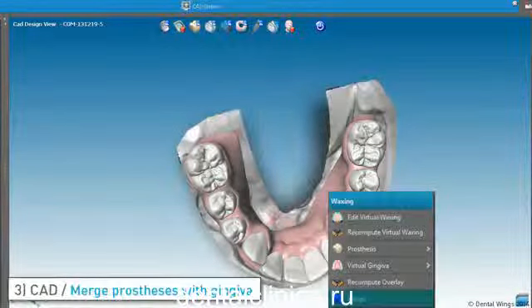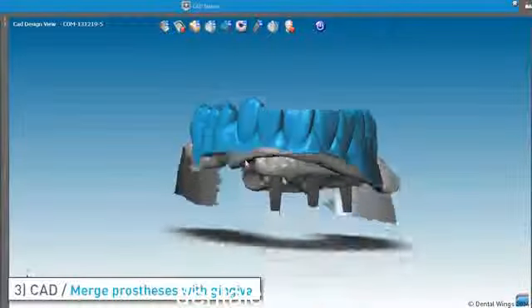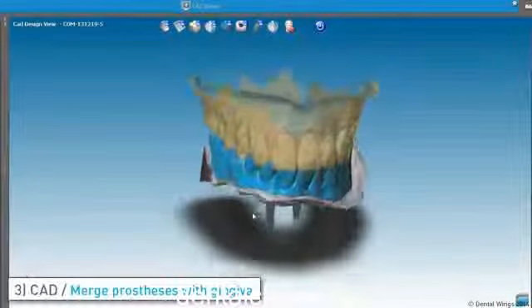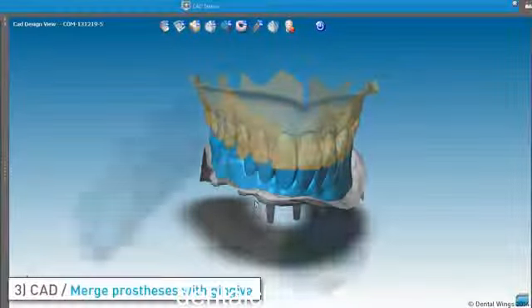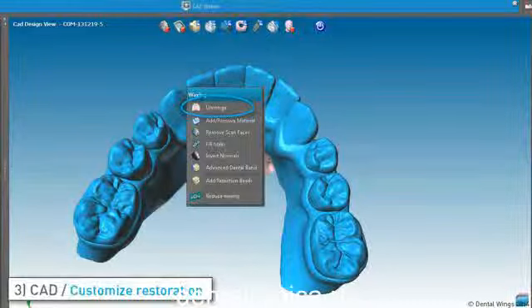Once the anatomies and gingiva are merged, the result is managed just as a waxing that would have been scanned. You know they are merged because the new element appears in blue, just as the traditional waxing does. Merging is always reversible, thanks to the unmerge function.